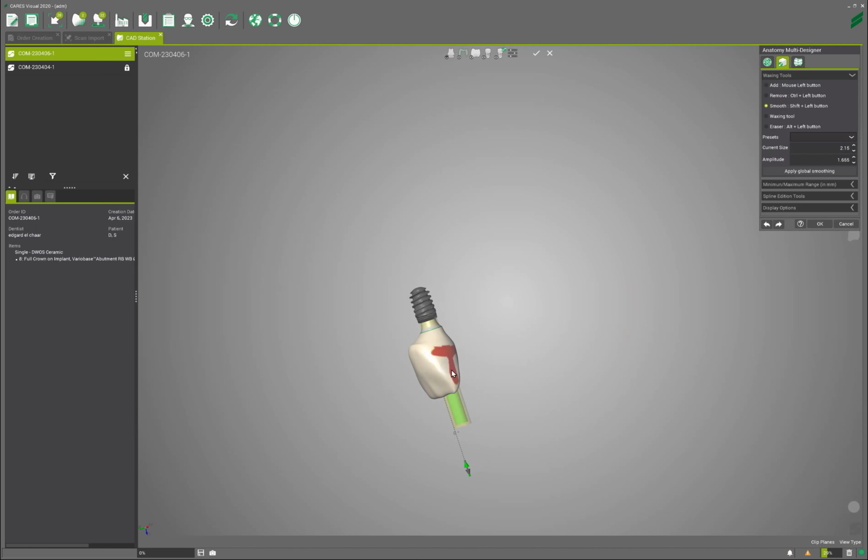Now, again, there's nothing perfect. We're gonna have some adjustment that we need to do at the time of the surgery. But if I can make my life and restoring life much better beforehand, we will do that.